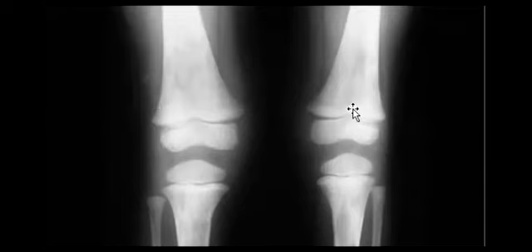Yes, perfect. But what about the metaphyseal region itself? What do you think about Erlenmeyer flask deformity? Yeah, then you can think that there are some irregularities. You can say that this area is heterogeneous in the density, between lucency and sclerosis. So then what is your differential? Abnormal.